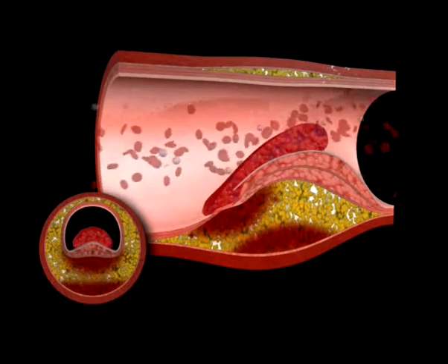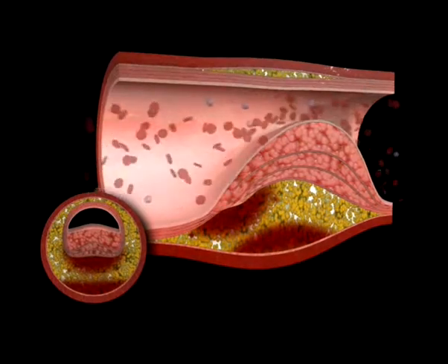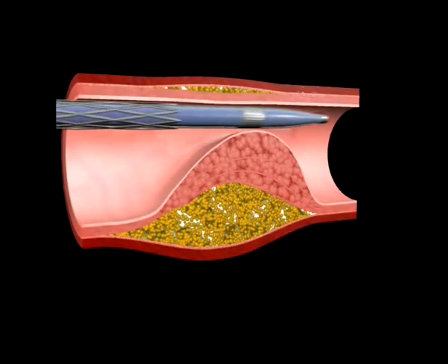Some of these stents are coated with drugs that are eluted over time and help reduce the buildup of scar tissue around the implant. Because angiography does not visualize the lesion itself, only the lumen, it is possible to select an incorrect stent length and diameter.